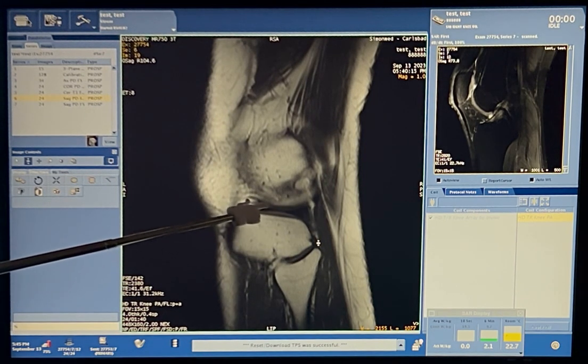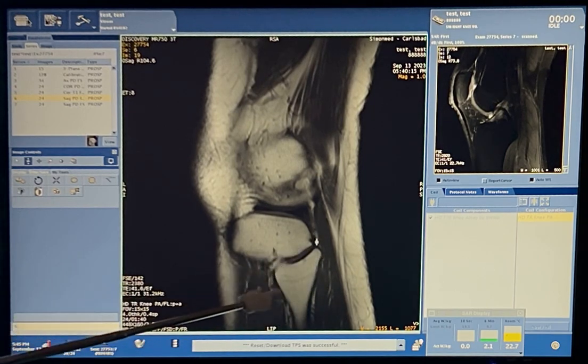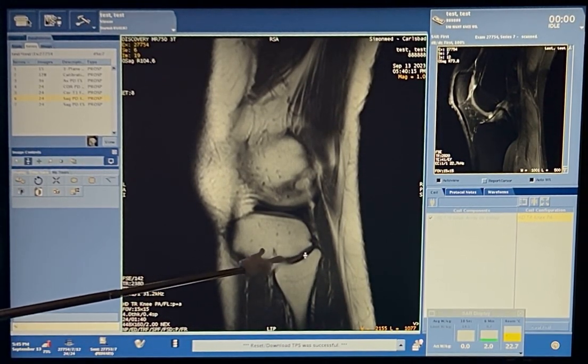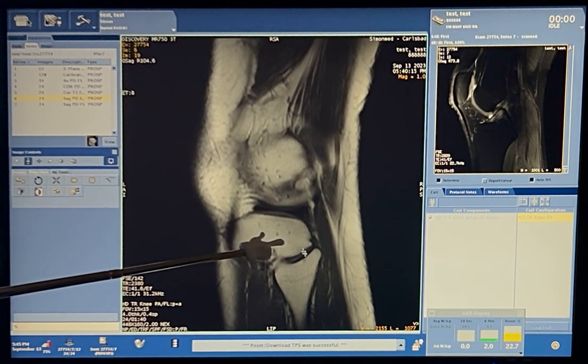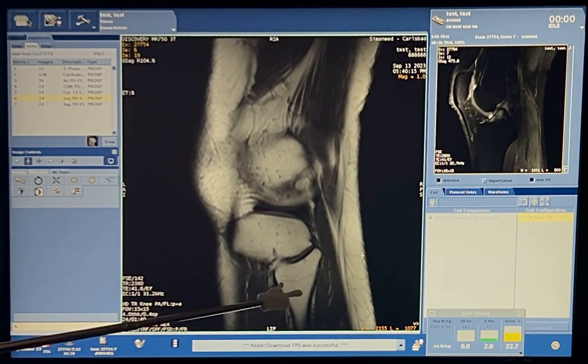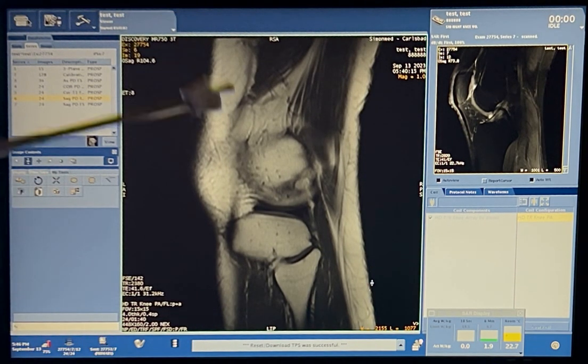So this is the lateral meniscus, because here you have the fibula. This is the fibular notch on the radius, or I'm sorry, on the tibia, where these two articulate. And between these two bones, you have the interosseous membrane. Anything else? Oh, the same thing that was right here? Yep, same thing down here. Okay, keep going the other way.